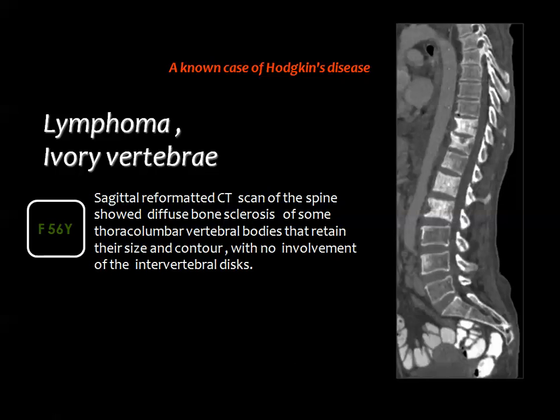In the spine, one of the differential diagnoses of sclerotic vertebrae are the lymphoma, metastatic disease, and Paget disease.